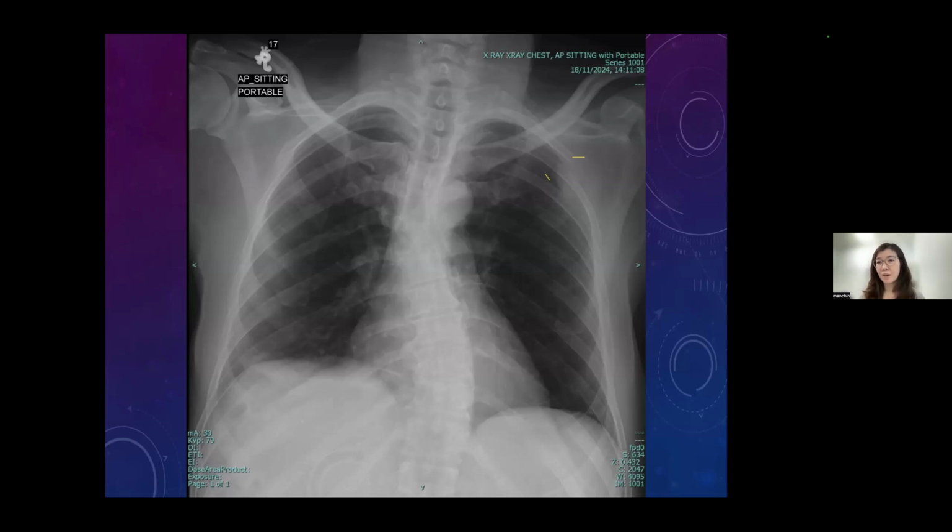This one is about review area. Okay, Jabal said right upper lobe collapse. No, if there's right upper lobe collapse, you will see a golden S sign with the whole right upper zone being opaque. Okay, in this case, you see both upper zones are fairly symmetrical in density, so there's no collapse here. Okay, so what else? Review area.